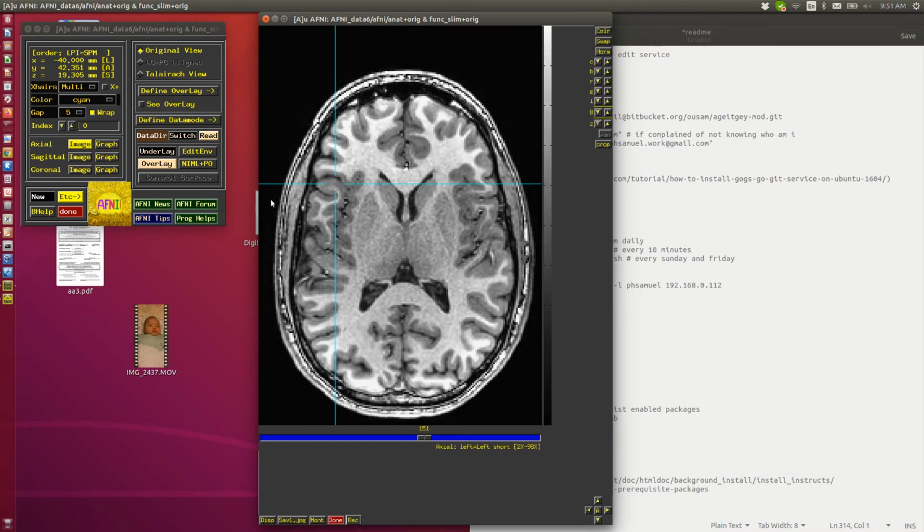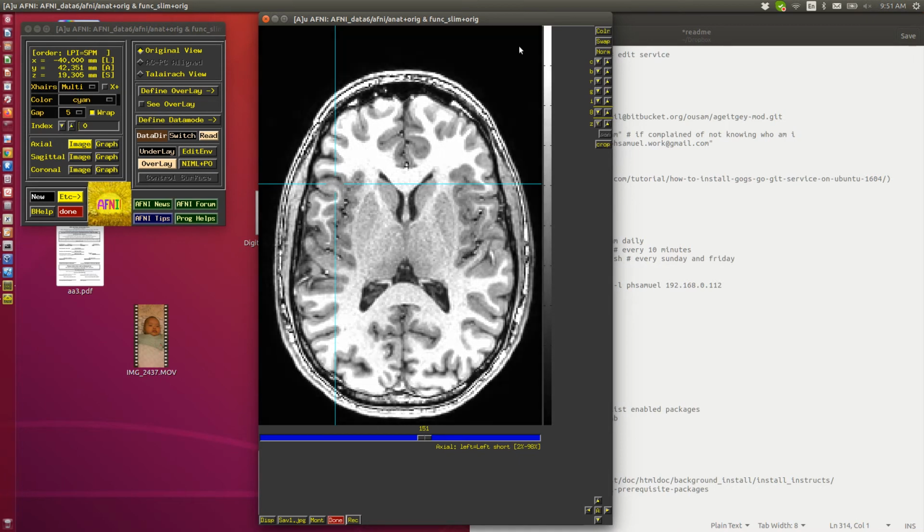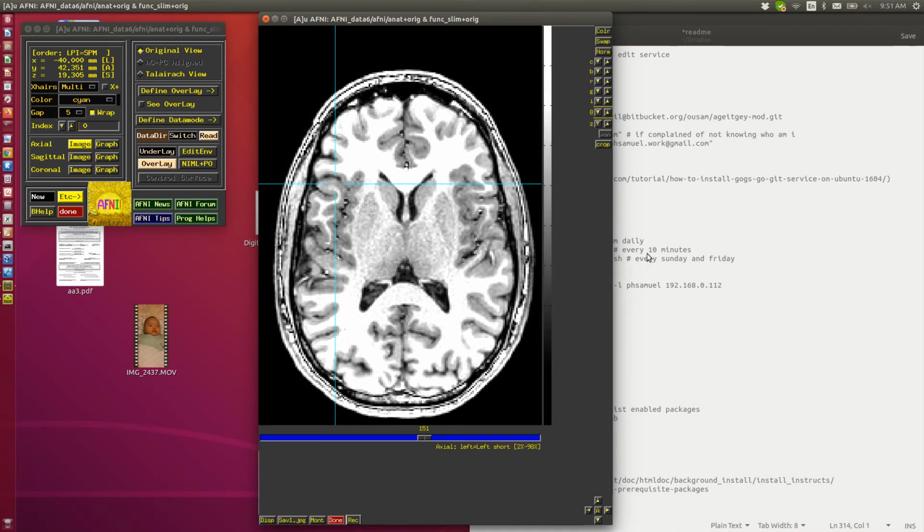Actually, it's changing one of brightness and contrast. If I drag it vertically, it's changing the other one. Which one? I don't remember, and I wrote the software. Because I don't need to remember, because I can just drag it around so it looks good.